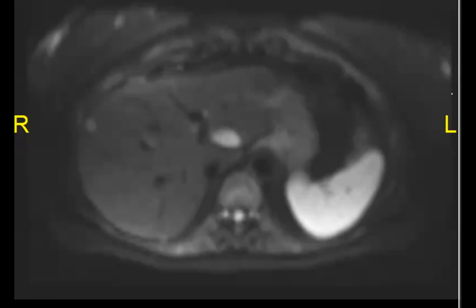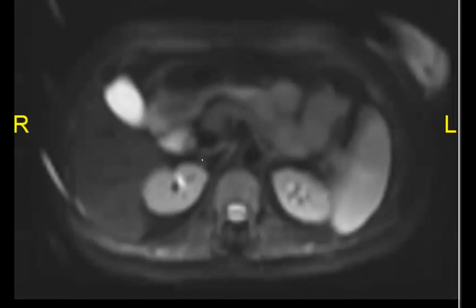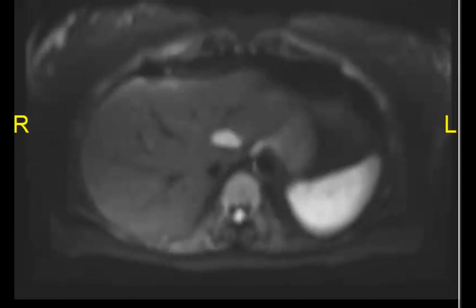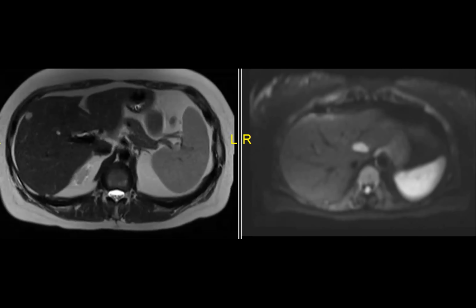So then the next case, because sometimes it just randomly picks out. Anyway, this was also an outside study. Let me take out the measurements. Okay, so you can see here, I focused on this one lesion because it was the largest, but there are a few of these punctate additional lesions. You can see it's ovoid, right? It's kind of T1 hypo. Looks like it has diffusion restriction. Here's T2, right? Kind of moderate signal, not quite as bright as fluid or even as bright as fat.